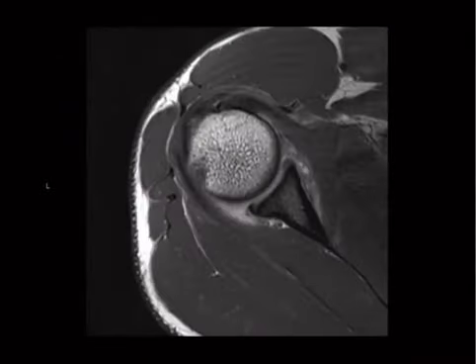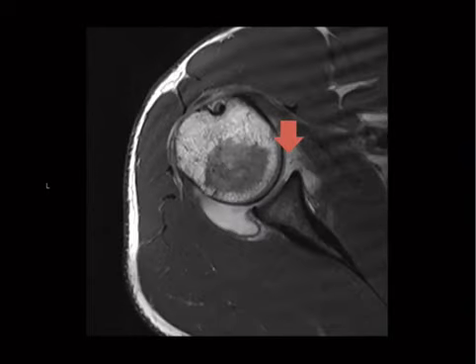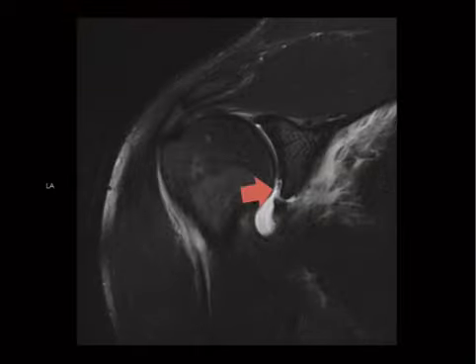So it looks something like this. This is cartilage intact, and then it's missing right through there. Cartilage, and then missing right here. Like a piece has been bitten off. See that? It's probably easier to see in this plane. Cartilage is gone.